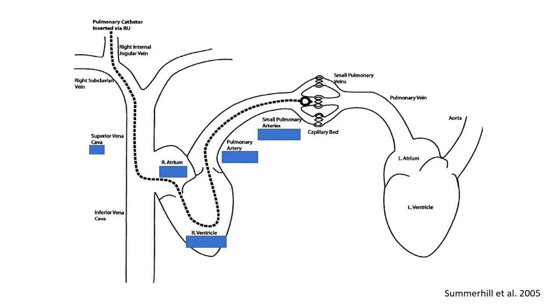All right, so let's talk about some pathologies. One thing to keep in mind when you're floating the PA catheter is what are your normal pressures, because as you float this, you're going to be recording the pressures that you get from the CVP/right atrium, the right ventricle, the pulmonary artery, and then the wedge if you wedge the catheter.